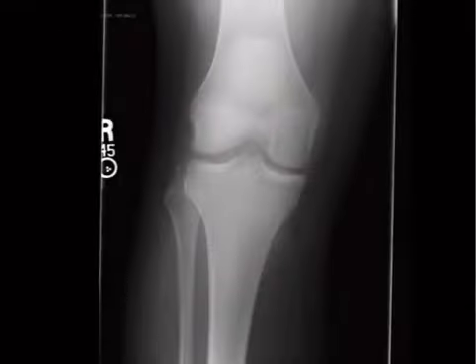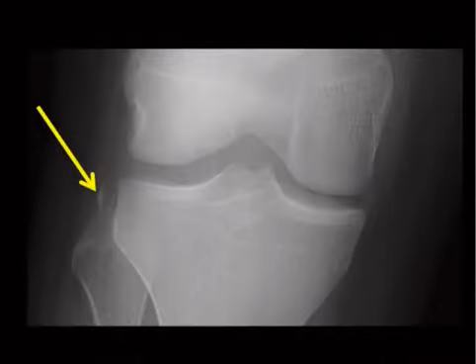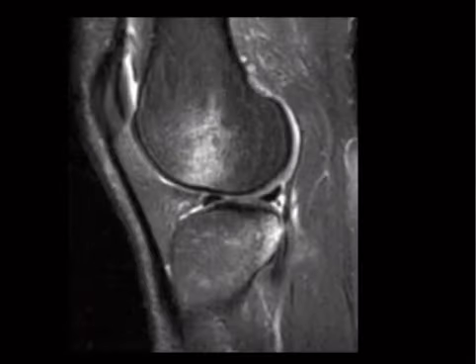Moving on, out of the ankle now, moving into the knee. Right there, that thing. So we're on the lateral side here. That is a so-called Segond fracture, right? And when you see that, you're supposed to think about this.